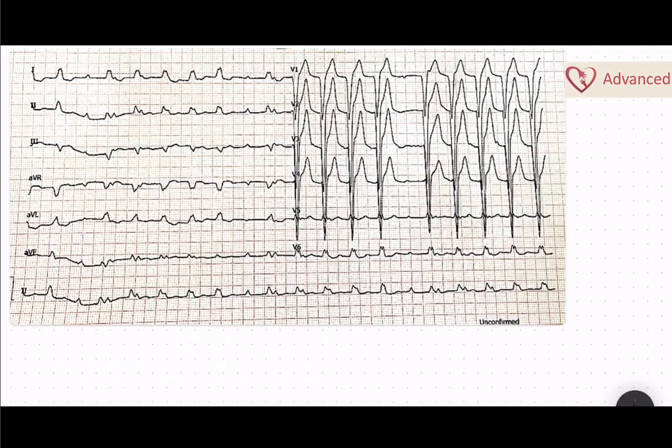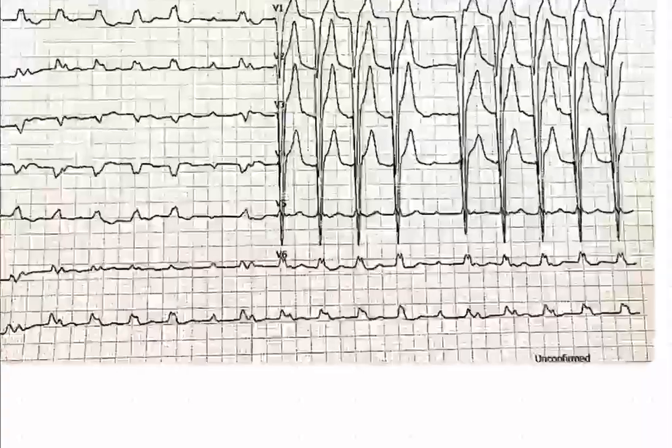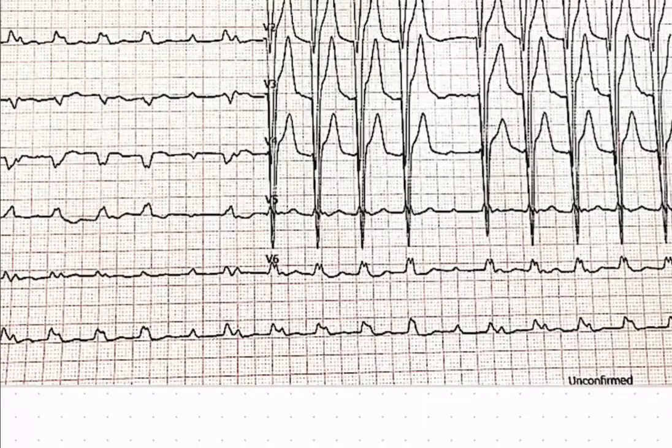Today, we'll be discussing an ECG from an elderly patient with a fever. Let's analyze it together. Pause the video, take a moment to focus on the ECG, and I'll provide a thorough explanation shortly thereafter. Now that you have had a chance to look at the ECG, I'll point out a few things. First, you can see that the QRS complexes are irregularly placed, obviously irregular.